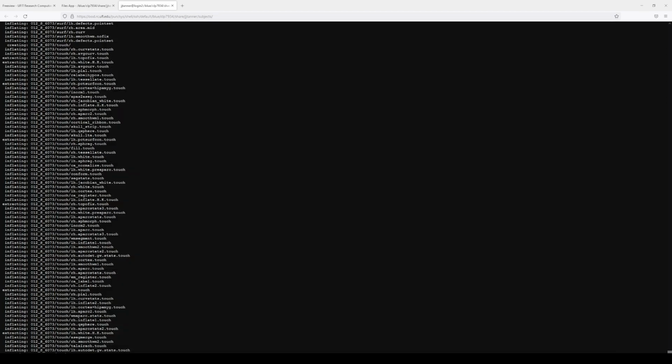I am in my subjects directory that I have created. This is in my share folder, in the share, and then my folder, and then subjects. And so this is where I'm putting the FreeSurfer subjects processing that we're doing. And so I could paste that in, hit enter, and it would download. So this is going to fetch from this URL, and then it'll save as this tutorial data tar.gzip. And I'm not going to do that. I'm not going to use the tutorial data for this, but if you want to, you can.